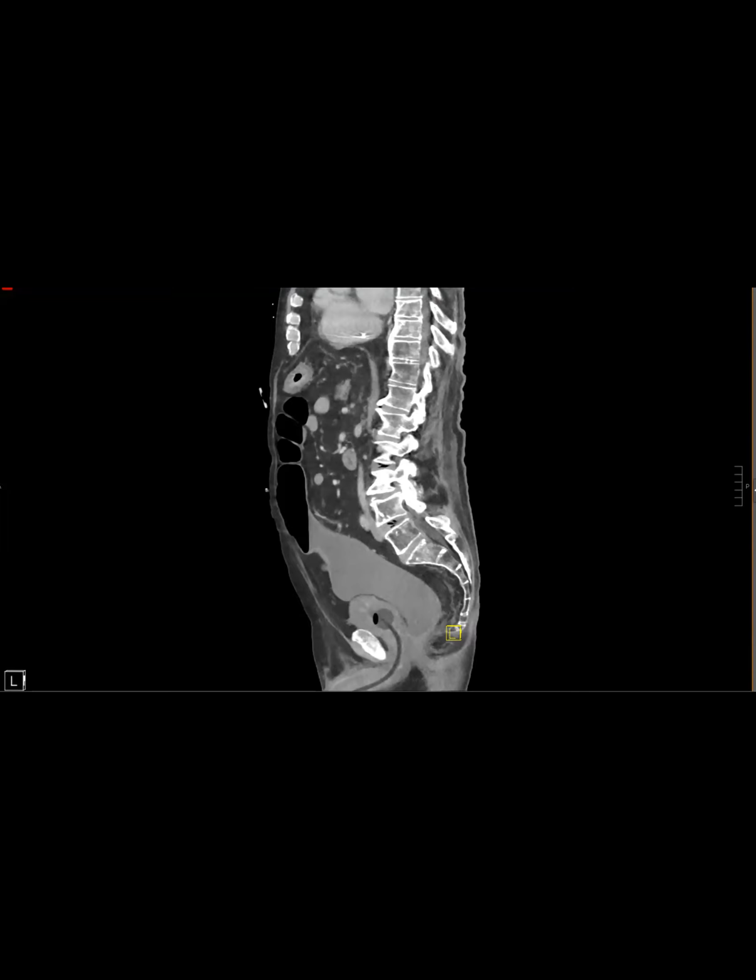I'm going to pause my share so that I can pull up the report. One second. So keep talking while I pause share. A mural issue could look like cystitis cystica in a collapsed bladder where you really couldn't tell what you're looking at. It might be some diverticula within the bladder wall that are trapping some fluid too.